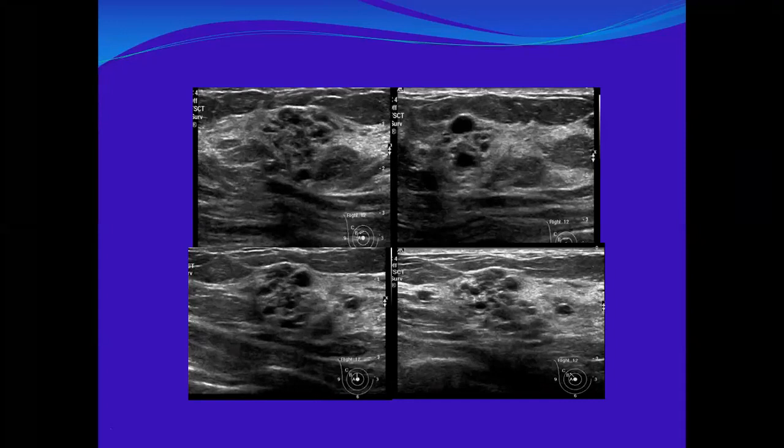Biopsy was reported as optional. I don't know, related to the physicians or the patient's concern. Biopsy had been done and it was proven to be fibrocystic. So a focal asymmetry can be caused by fibrocystic change.